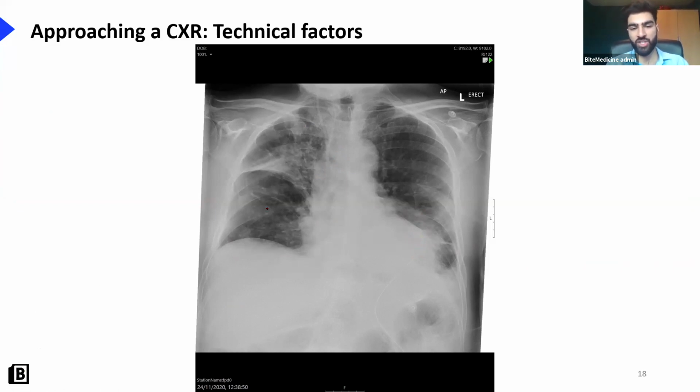So someone said exposure, but I think I can just about see vertebra behind the heart, so exposure is good. Maybe it's not projecting well on your screens, but I can just about see the vertebra behind the heart. So rotation, if we look at the clavicular heads, those are the clavicular heads there. And where is the spinous process? It's here. So does that line the midline?